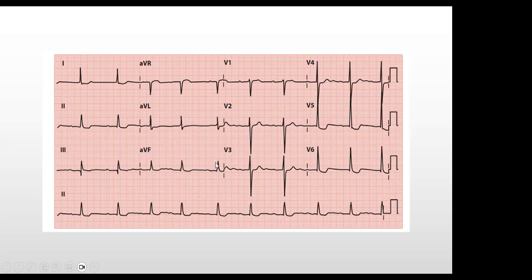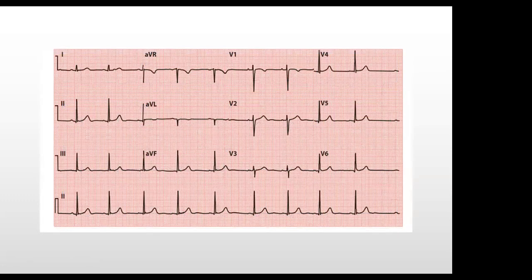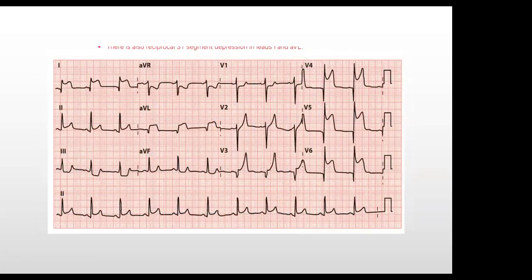Okay. Straightforward. What do you think? You're reminding us that we can still have a normal ECG, so that you don't think of abnormality all the time.